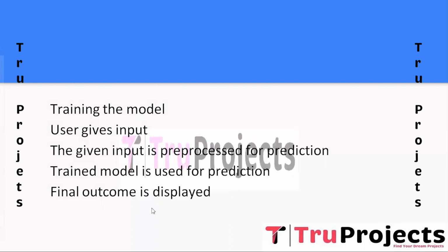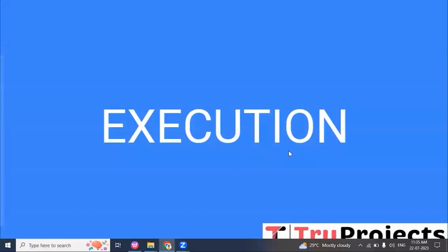The system uses the given predictions to generate the final classification result, the outcome indicating whether the retinal image indicates glaucoma or not, or whether it is at the moderate or the severe level. In this way, we display it to the user through the web application, providing a reliable tool for early glaucoma detection.